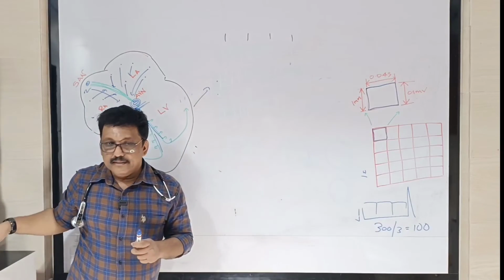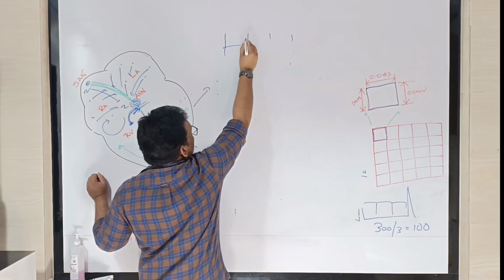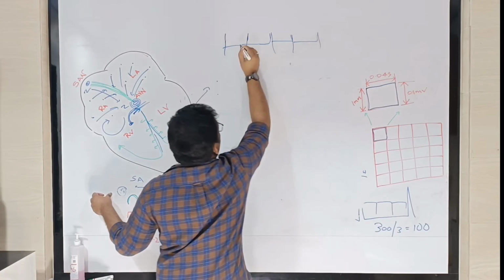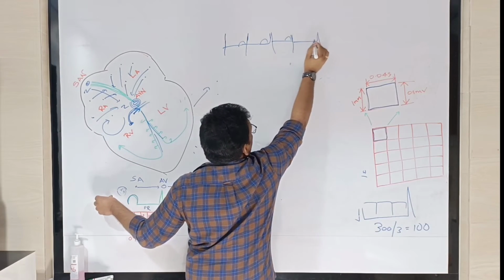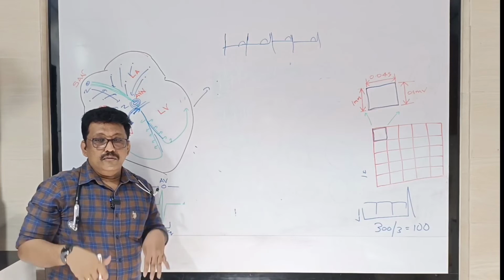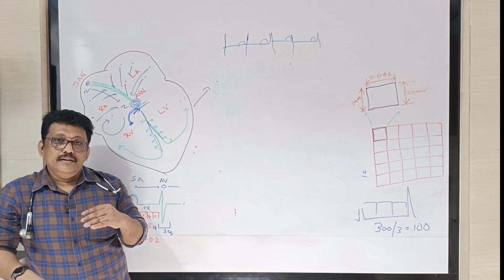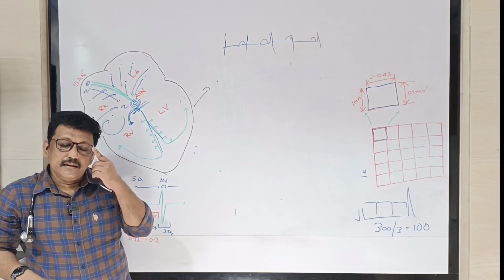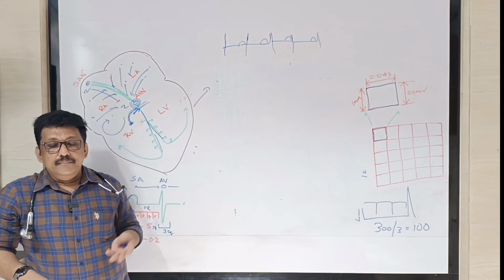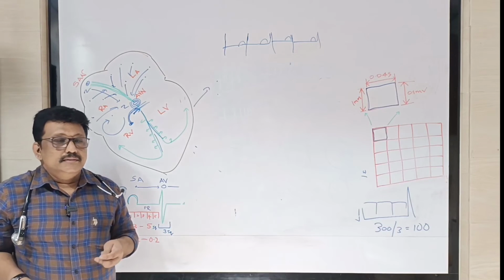Now we will be talking about bradycardias. These are also rhythms that come in the ACLS protocol. So we already learned normal sinus rhythm here. So this will be something like a normal sinus rhythm. If the rate is going down less than 50, what is the problem? If the patient is having a very low rate and it is compromising the circulation of the patient, then the patient can have giddiness, dizziness, altered behavior, loss of consciousness, syncopal attack. All these things can be produced by this problem.